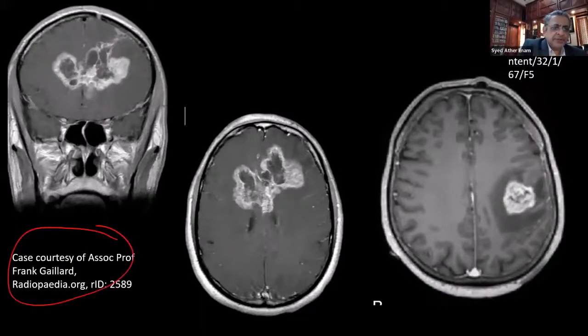Here, this is again from Radiopaedia. So again, a tumor which is crossing the midline, butterfly. That's why it's called butterfly. Well, maybe it does look like a butterfly, right? Maybe. And it's crossing the midline. This patient is different, from a different source, where it is pretty solid. It's not ring enhancing over here.